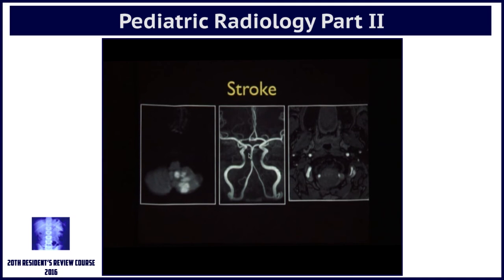Brain angio is done. Neck angio was not done in the interest of time, and the child was not very stable. So here if you see, suppose I didn't show you the source image, then there's a very high chance of not even looking at this area. So here you see there are two lumen like things. There are two flow areas which are white and seen on the source image over here. And this one is actually the intramural hematoma, the one which is lateral.